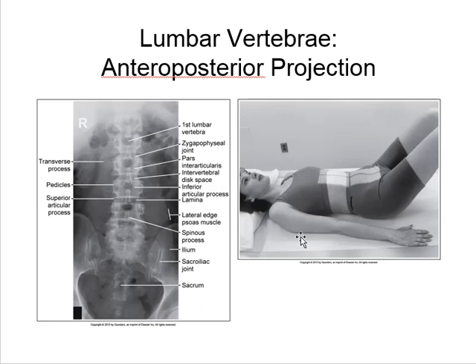But if your positioning in your hospital calls for positioning at the iliac crest, you can evaluate the anterior pelvic bones possibly, and you could also evaluate the lower ribs. So a lot of different things that you can look at to determine whether or not the patient's rotated.